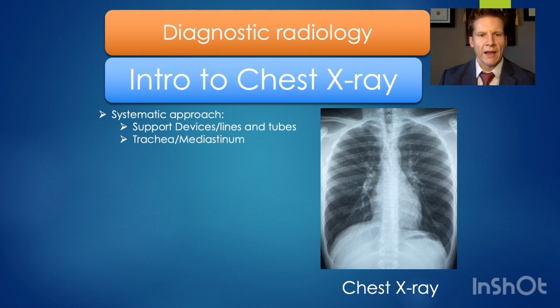Now, after that, you want to look at the midline structures, so the trachea, starting off with the airway, following it down to the carina, and identifying the left and right main stem bronchus. Don't get confused if you see subtle tracheal deviation related to the left-sided aortic arch. In fact, if it's deviated slightly to the left, that could be a sign of a right-sided aortic arch, which could also be sometimes subtle.